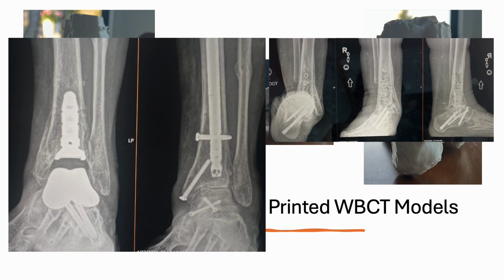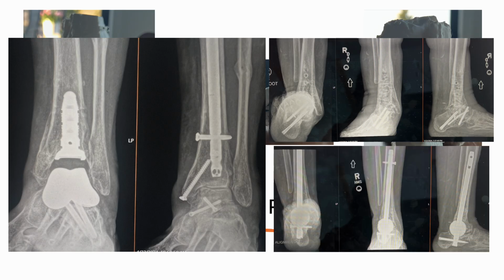This patient had a total ankle replacement done by my partner. Ultimately, she ended up failing that. Then she had a fusion done where they used femoral head. Ultimately, I think during the time of healing, she started walking on it too much, and she ended up in a valgus position. I got weight-bearing CT scans on the total talus and this custom sphere, and we ultimately did a custom sphere for her, and she's done well with the custom sphere down the way.